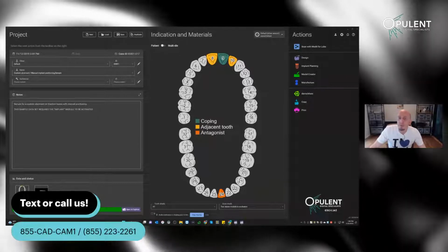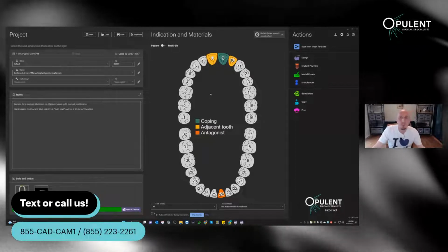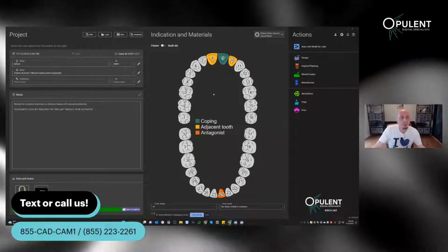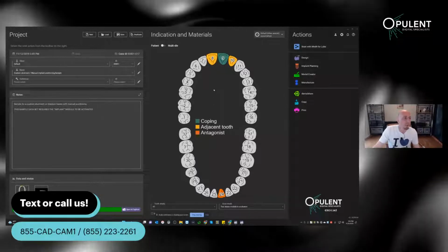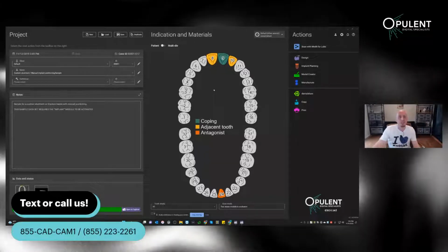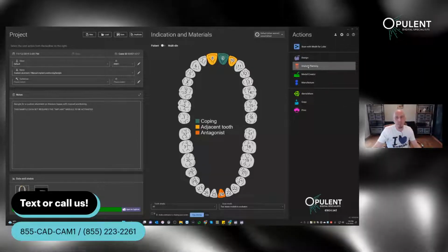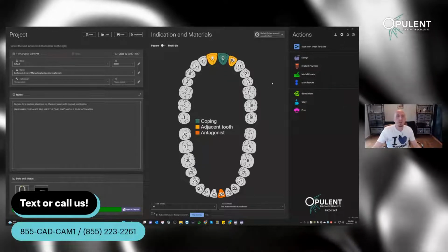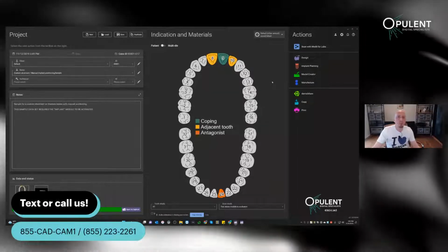All right. So today, plain and simple, this is one of the demo cases. When we're installing Exocad, we already incorporate everything in here. So you see that there's already the implant planning available here, and the partial would eventually be available, etc.